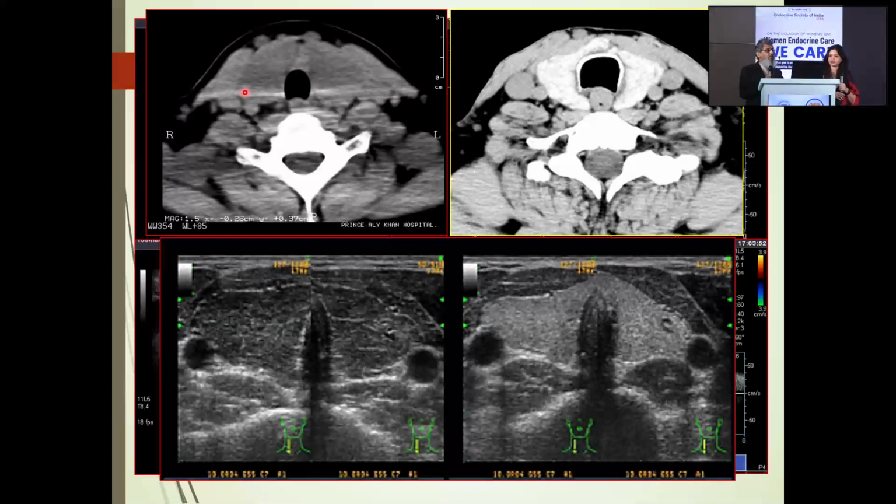Similarly, ultrasound also corresponds, in that a normal thyroid looks very simple compared to the strap muscle. Here the strap muscles and thyroid look similar, and there is a lot of fibrotic background, by which this looks like a cirrhotic liver, something like that. So the thyroid starts looking like that. So that's the general descriptor.